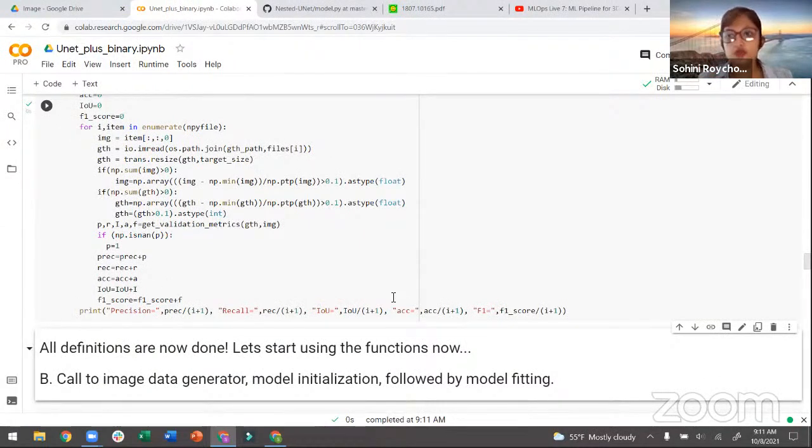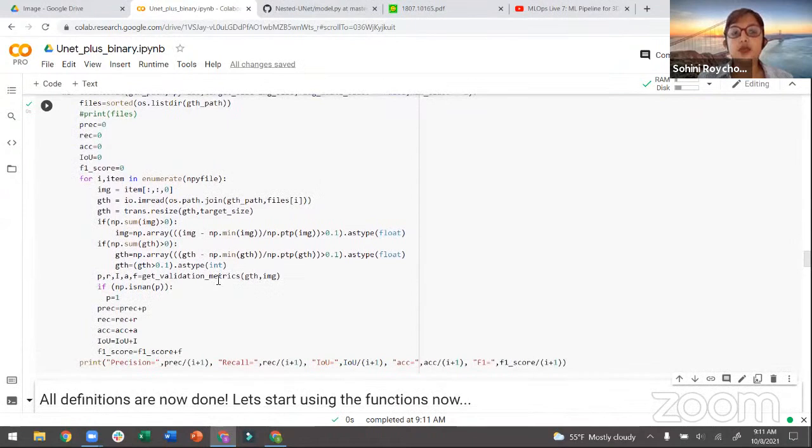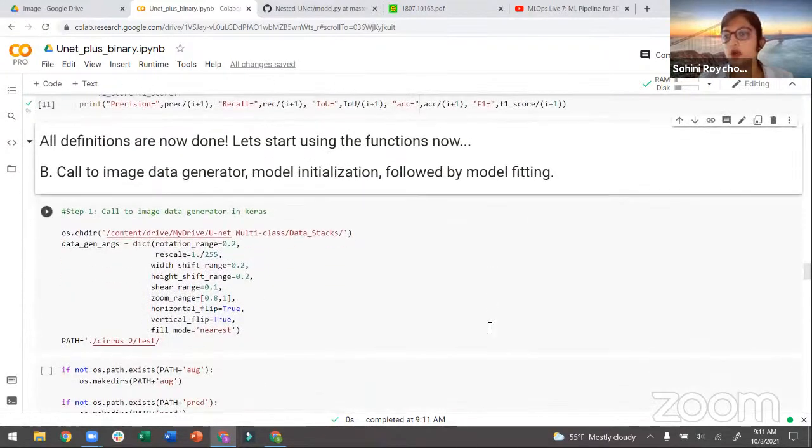But what I wanted to also show you is evaluation. In the last few videos, I've not been showing evaluation and metrics. In this case, because it's semantic segmentation, evaluation is again on regions of interest. So precision, recall, IOU, intersection over union, accuracy and F1 score. Accuracy, I'm calling pixel level accuracy. So everything put together, those are the parameters that I'm going to be evaluating against.